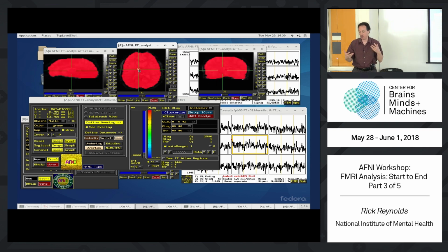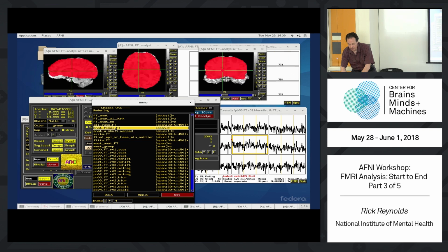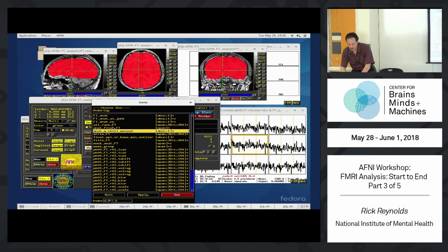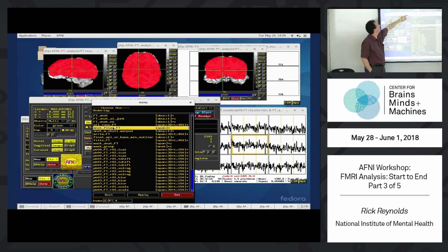Looks great. Why would you not be happy with this? Well, let's look at it with respect to the T1 data set, the anatomical volume, and see how happy we are then. You want to see the anat final or anat final with skull? Let's say with the skull stripped version. So now it doesn't look so great. Well, missing this part, of course, is understandable, right? We don't have coverage down there. We wouldn't expect it. But you see it drifts up here, and that's, of course, going to be due to the signal dropout.